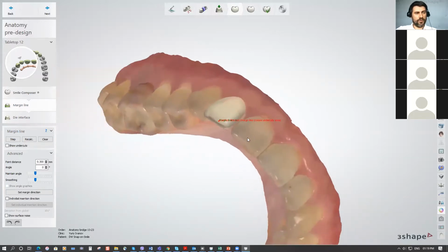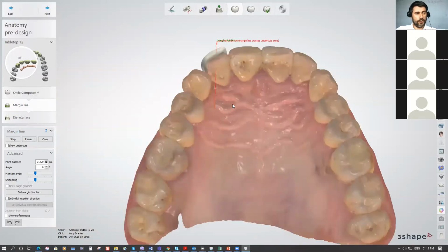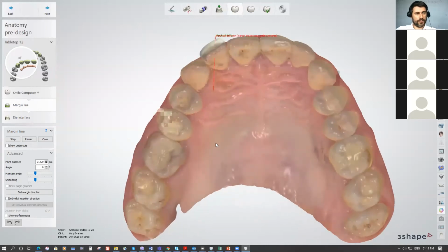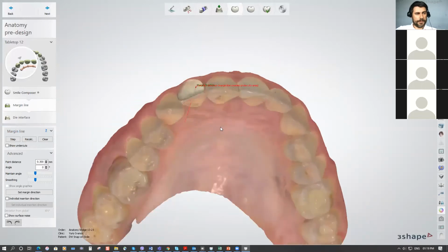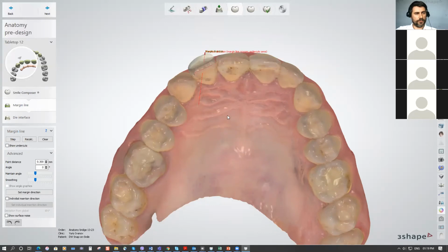But if you wanted to change the occlusion over the posteriors, you need to keep direction from the top, from the occlusal view, something like this. And again, it depends on the purpose of the tabletops you wanted to use for. It's just aesthetical, or you wanted to realign the occlusal surface, the occlusal tables.